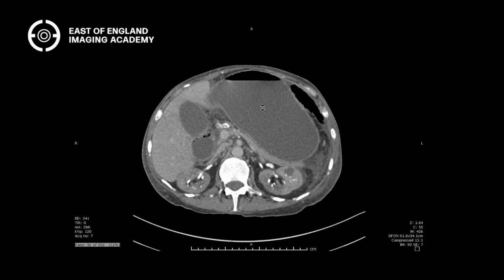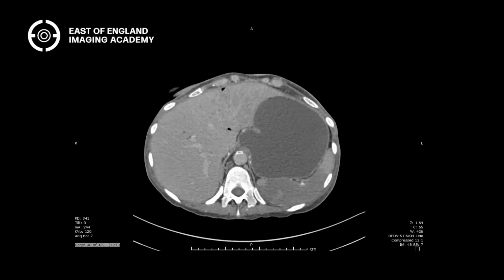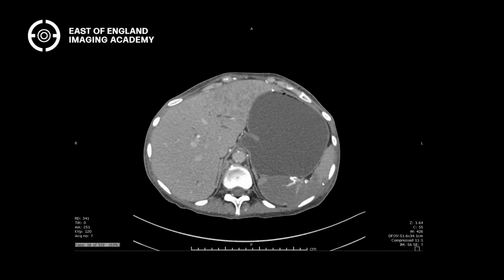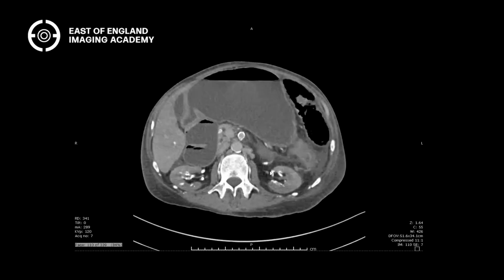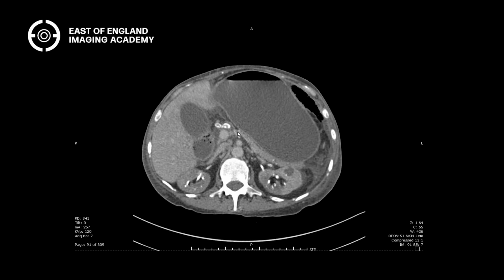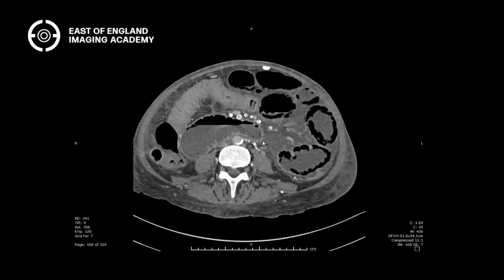So for example, this patient, okay, let's go very briefly through the anatomy. What organ is that? Liver. What's this one? Spleen. What's this one here? Stomach. What are these two back here? Excellent. And what's this thin thing coming across there? That's pancreas. Excellent. And these are all bowel loops, right?